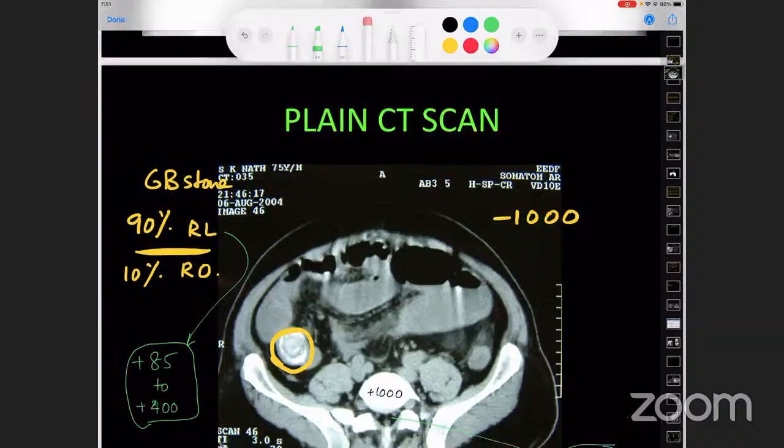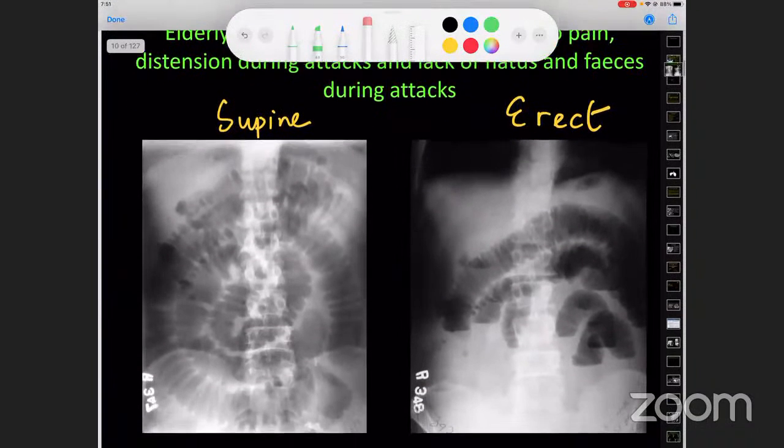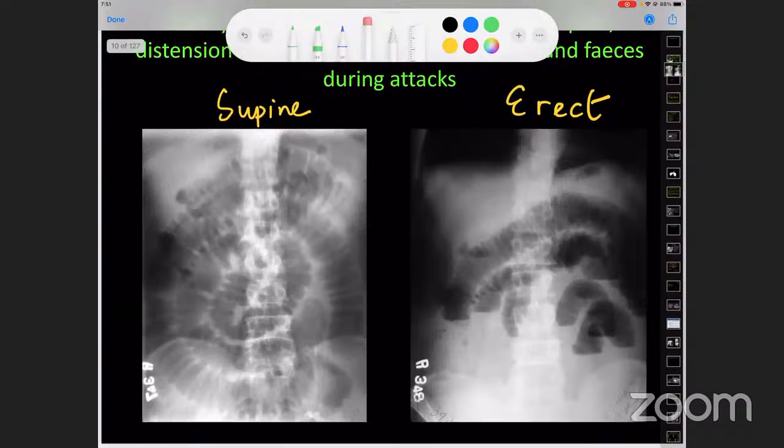Okay. So Avik, the second question is, why didn't we get to see the stone? It was such a large stone. What happened to the stone in this area? The stone is, okay, this is the stone. I was also thinking where it is. It has gone. Yes, I was thinking about that. So where is the stone?